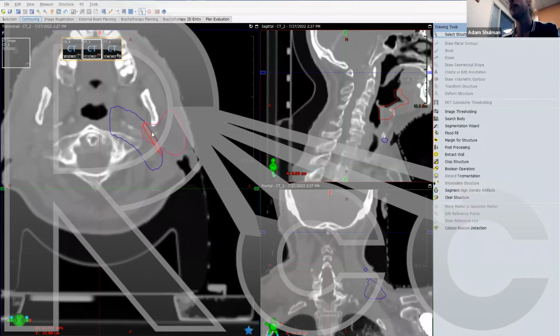If you analyze your coverage of a large volume PTV 54, and you include in that analysis a PTV 66 and a PTV 69, that's going to water down your DVH. So your shoulder might look good, including all those other high dose PTVs. But if you look at only the PTV 54, subtracting out your other high dose ones, maybe that shoulder drops and you didn't quite get your coverage. So yes, you want to analyze on your ZPTV Opti Max.